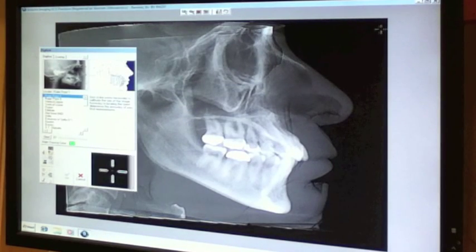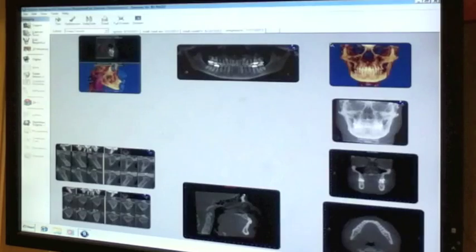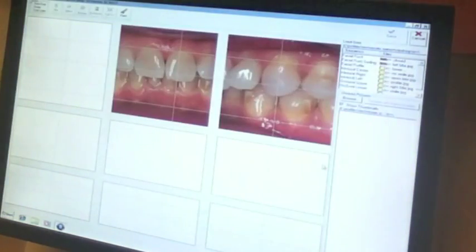I think all of you know what to do from here. So once that's traced, yes, cancel that. And to complete the template, you'll now import the patient's photos. To do so, you'll go to Capture Scan and Start Capture.